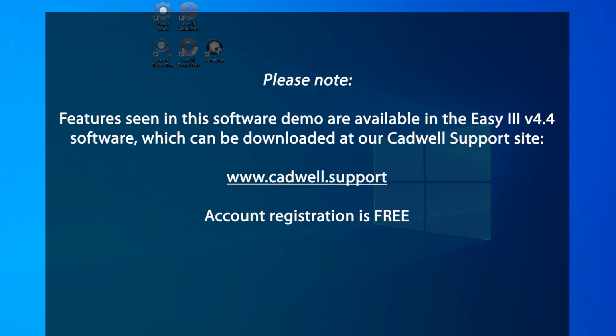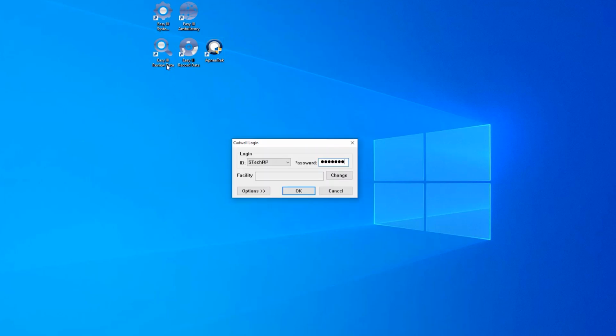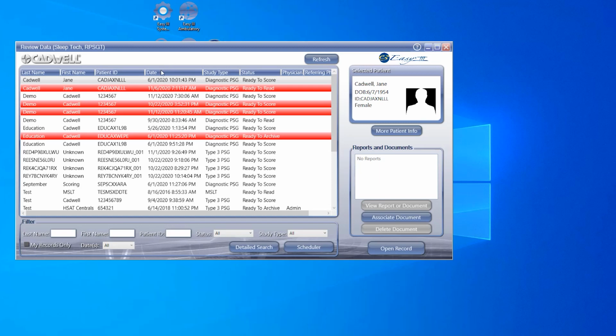In this video we will cover how to review a record. First, open your EZ3 Review Data Dashboard. Once open, you have several ways to locate a record for review.